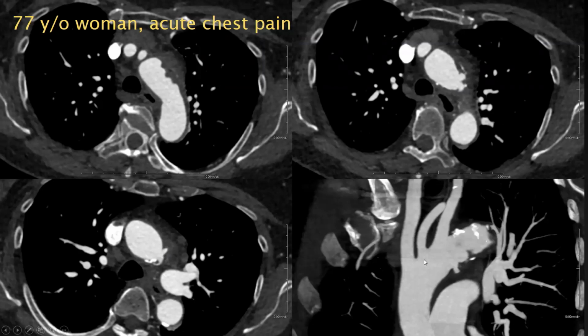And here you have a reformat, and you can see there are a lot of irregularities and plaque and ulcers in the arch and proximal descending. But here on the undersurface of the arch, you can see one penetrating atherosclerotic ulcer, and on the non-contrast, there was a little bit of blood surrounding just this lesion. So that is an acute penetrating atherosclerotic ulcer in the arch.